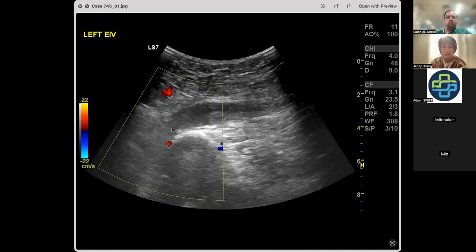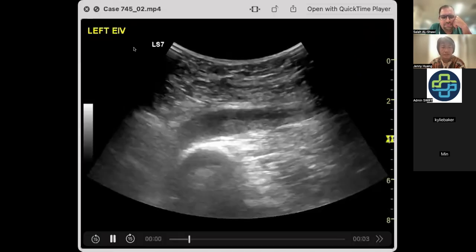I can see Sulla, as he's looking at this image, he's going tut tut. He's a bit critical of it because he knows it's my picture. What's this number here show? The gain? The scale. So the 22 for venous. To be fair, most of the time you quite easily see venous flow on that. But before I'm going to say there's no flow, I probably need to drop that down, don't I? Because we're not looking at an artery, we're looking at a vein. So maybe it's just slow flow.